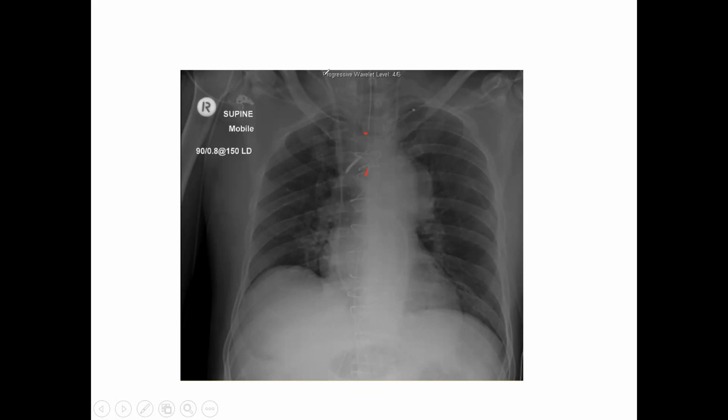We looked at a central line earlier, but if you've done any type of hemodynamics, you may remember the Swan-Ganz catheter. Swan-Ganz catheter, your pulmonary artery catheter, the balloon tip, flow directed catheter. Those are all terms that may be utilized on the TMC exam when you go to take that. But you've got your balloon tip, flow directed catheter, and this is where you would get your CVP off of that.